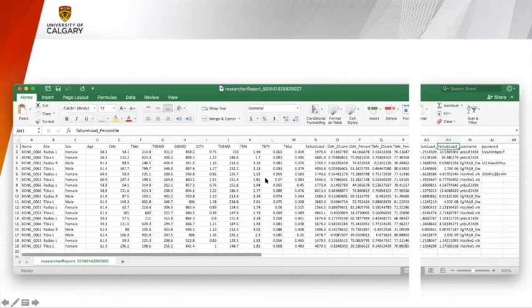And then this is where the actual data is, the real, quote unquote, money. I've broken it here in the middle because it continues on. But the first part of it is a regurgitation of what you input. So the output has the exact same information as what you input. And then in parallel to it, for every one of these parameters starting at cortical area, it shows the Z-score and the percentile for that person. So you can then, for example, look at the percentile of cortical area for men versus women by regrouping this and finding averages, etc. So it does that for each of the parameters.